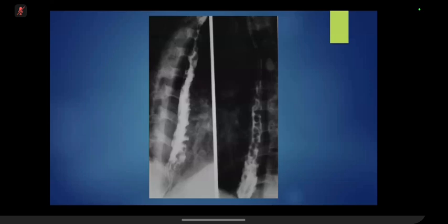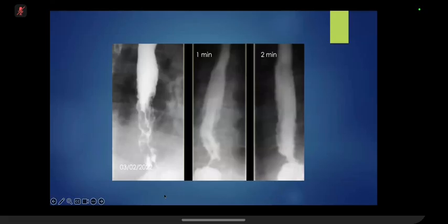And in terms of imaging, what would you do? If you are reporting it, what would you check first? Any endoscopy or any biopsy which might have been done for this patient, or any previous record. Yeah, very important, previous imaging. Yes. Let's go see. So these are the previous images.